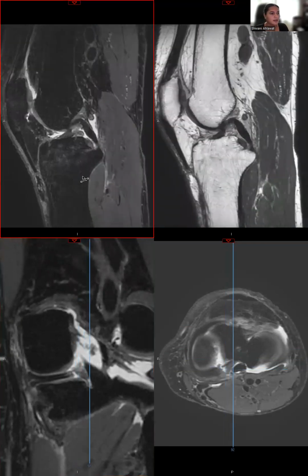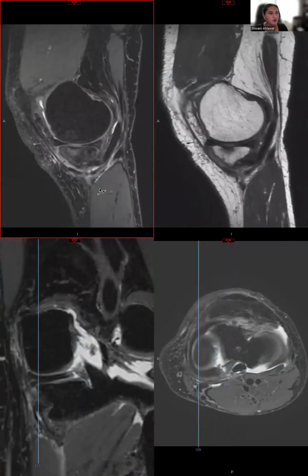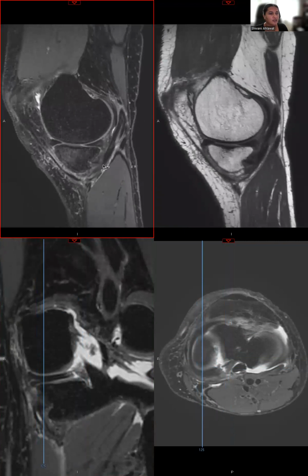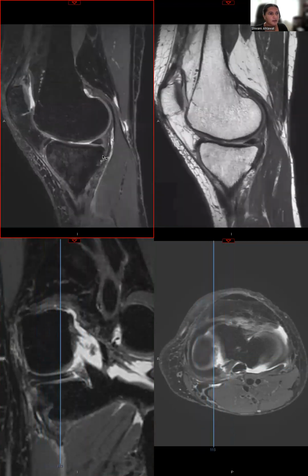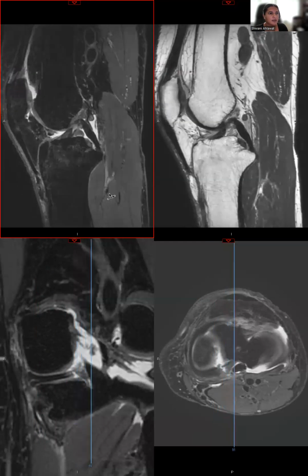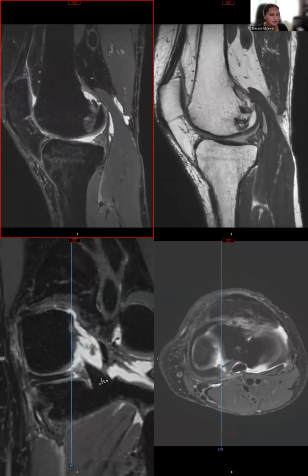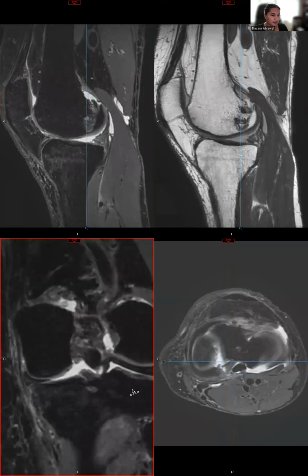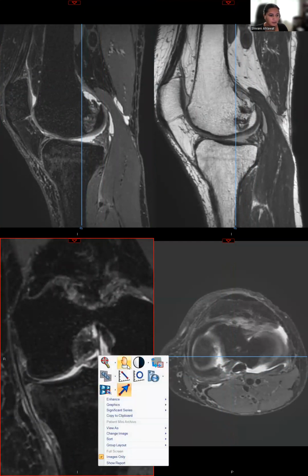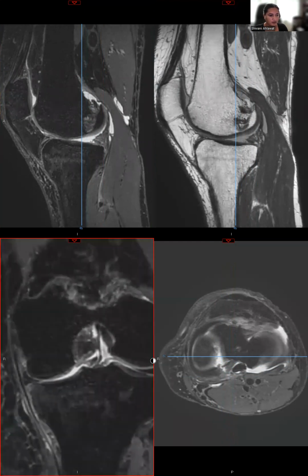So now looking at the same thing on sagittal sequences, I like to go from far medial towards the notch. And so we see triangular morphology of the posterior horn. We can see the posterior horn, then we don't see a posterior horn. So that's a ghost sign, also a supporting feature of a meniscal tear. And we don't see a definite, nice, beautiful root attachment. So this would be a radial tear of the posterior root that's complete. And there's associated medial meniscal extrusion and subchondral bone marrow edema in the medial tibial plateau due to meniscosteochondral unit dysfunction.